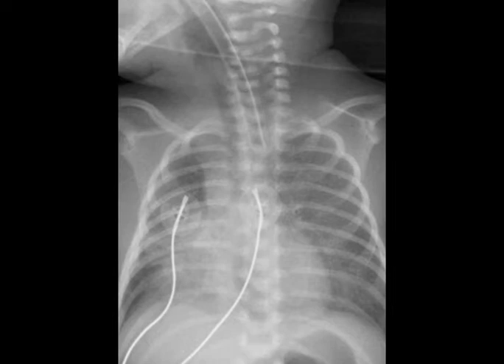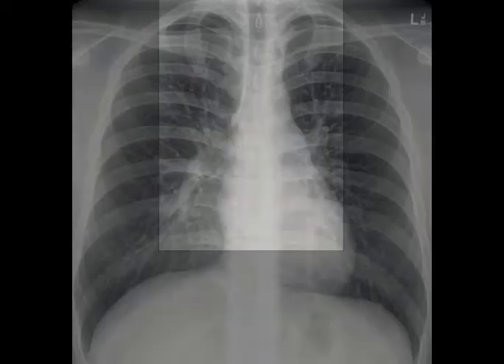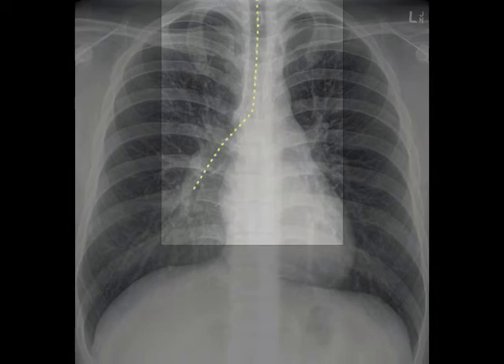So, like all of our other assessments in emergency medicine, we'll begin with evaluating the airway first. We'll start at the top of the image and trace down the trachea, down to the carina, noting that the trachea appears straight and midline. We'll continue to trace down both main bronchi, noting if the carina appears wide or narrow, and if there is any bronchial narrowing or dilatation.